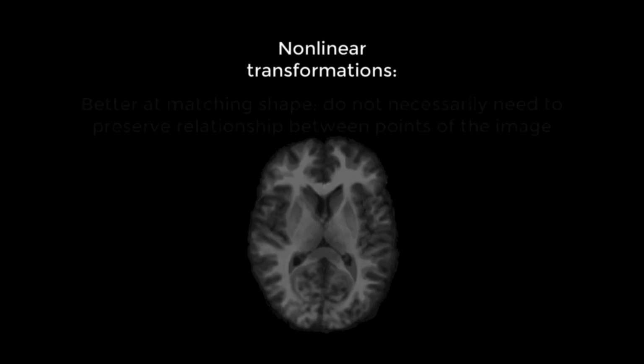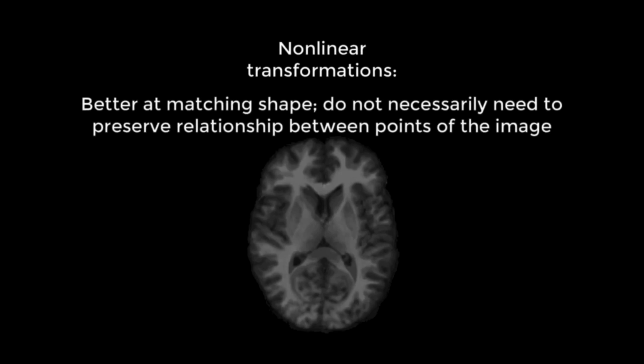Now, nonlinear transformations, if you're curious about that, are better at matching the internal structures, but there are also more chances for things to go wrong with the nonlinear warp. So you need to be very careful about applying that. Really check it to make sure nothing went wrong.